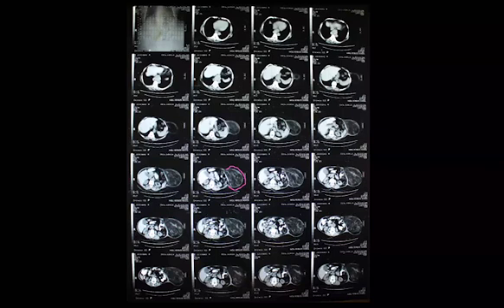Come on, Mona, tell us what's the news here? There's a bulge, a swelling on the left side. The left or the right? The left side. Which part of the abdomen? The upper or the lower? Upper. Do you really think so? No, lower. Let's continue with lower, even more lower.